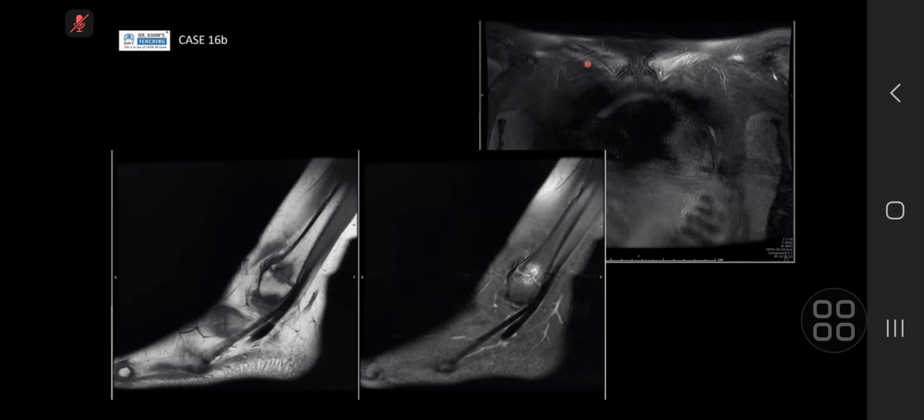So there's MR here now proving that on the right side you've got abnormal marrow edema. You can't appreciate the periosteal reaction as well, but maybe there's this elevation here and the bottom. And also on the left side, so bilateral clavicular involvement, and in your tibia and fibula, where you've got your peroneal tendons running along here. It's a metaphyseal region, as well as the clavicles. You think, is this infection, but putting two and two together, you rightly got it as a CRMO.